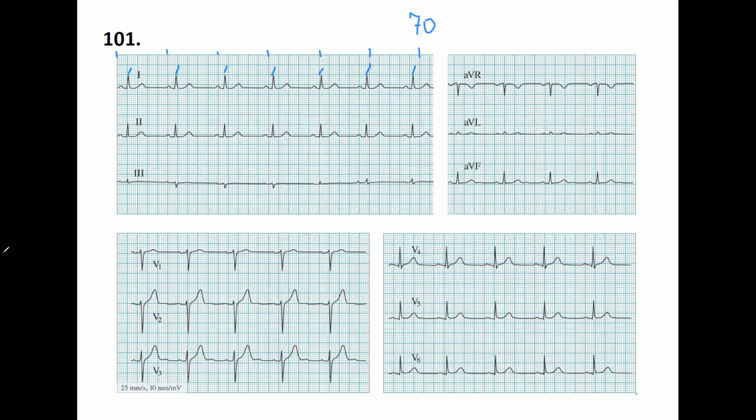Now, another thing that you should know right now, by looking at that, do we have P waves or not? But this goes for the next seminar, but it's very good to know that every P precedes the R, and the rate is in a normal range, and the P shape and the duration and amplitude is good.